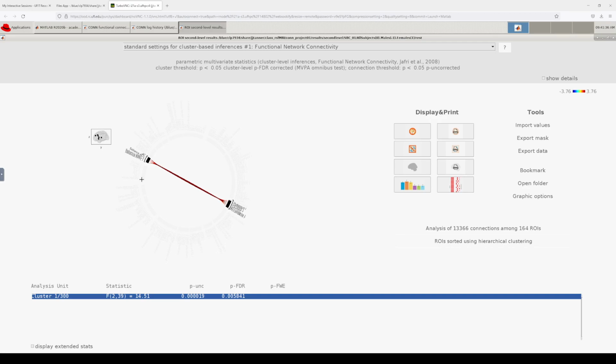or if you have a group difference and we're testing whether one group has higher connectivity than the other group, well, the higher connectivity means that one group might be, instead of a negative 0.4, a negative 0.2. And that's not necessarily good. So again, we have to be cautious in interpreting.